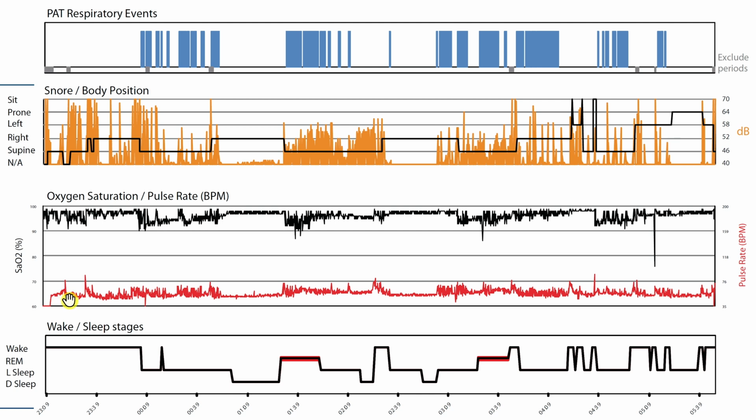It helps to really, with pulse oximetry, the greatest fruit you can yield from it is from looking at very zoomed in time frames and lining it up with respiratory disturbance. For example, flow limitation, which you can see in the air curve from whatever PAP or nasal cannula. It goes from left to right still, right? The time on the bottom still applies.